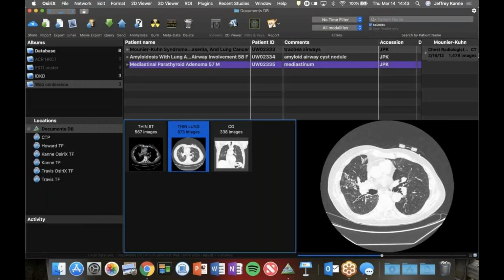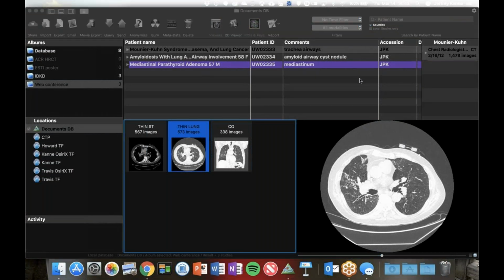Jeff, if this were small bowel, in my residency days, they called it the stack of coins appearance of small bowel folds. That's what this looks like, the stack of coins again. Yeah, that's a good description. It's interesting that a lot of that's the posterior membrane that seems to be in those folds. This is not as if we're bulging between cartilages that gives us outpouchings. It's as if there's something pulling inward, creating those little shelves that stick in from the back wall.